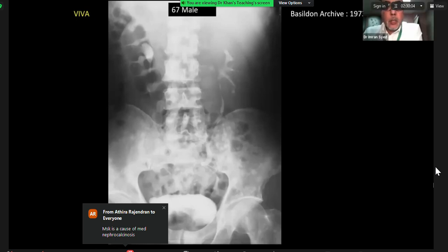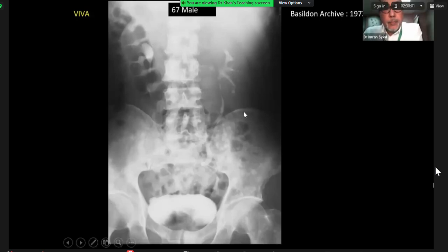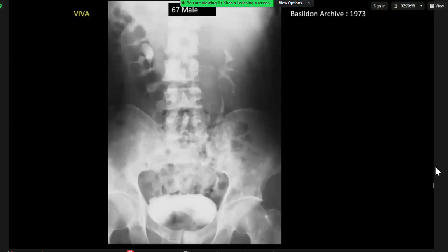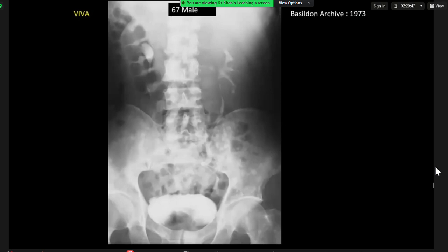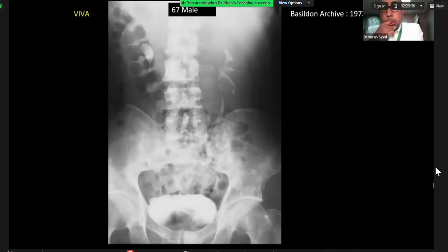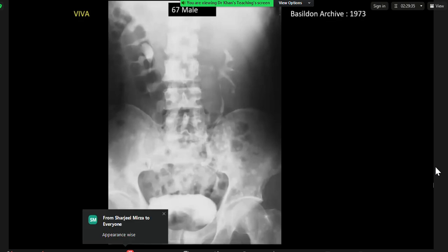Okay, and do you see anything in the bone? In the bones, yes, on review of the pelvic bones, I can see multiple sclerotic foci in both iliac wings and also possibly in the left proximal femora. Okay, so put it all together. That would make me suspicious of a prostatic malignancy with metastatic disease, possibly.